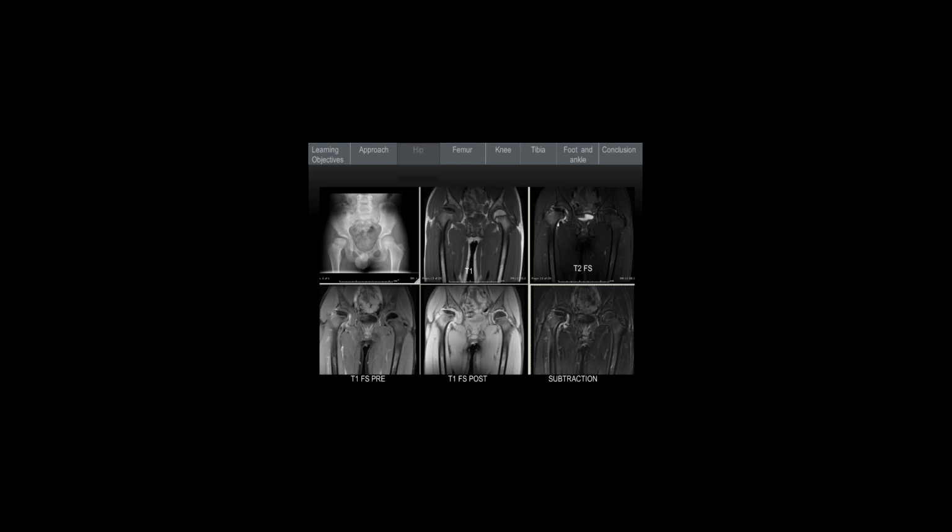However, if we choose to do an MRI, some orthopedists, especially with contrast enhancement and subtraction imaging, we know that we can better prognosticate what's going to happen to this femoral head in the future and what is the likelihood and risk of further collapse.